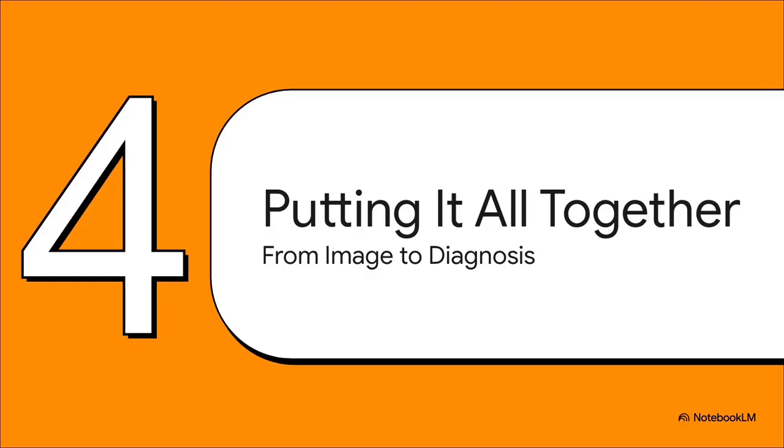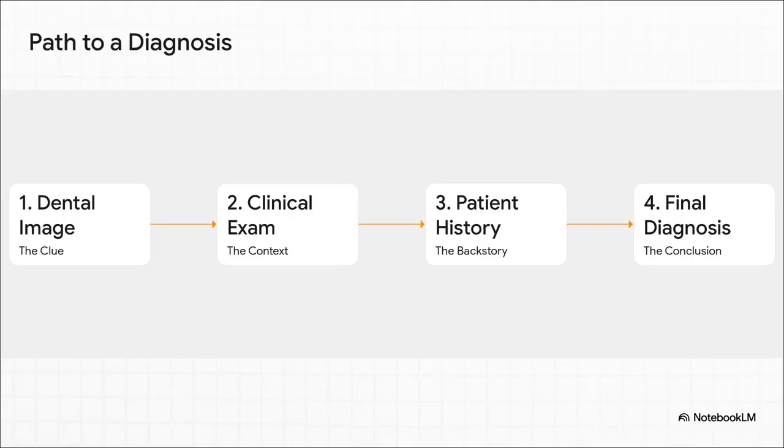So, we've learned the language, we've toured the landmarks, and we've spotted some trouble. But how does a dentist actually take this single black and white image and come up with a final diagnosis? Well, and this is so important to remember, the X-ray is just one piece of the puzzle. It's not the whole story.